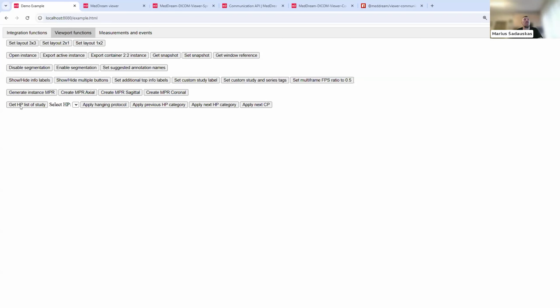What else you can do? This would be quite an important thing, because you can get a hanging protocol list of the current study. If I click this button, as you can see, it detected and showed me that I have 2 hanging protocols available for this study.